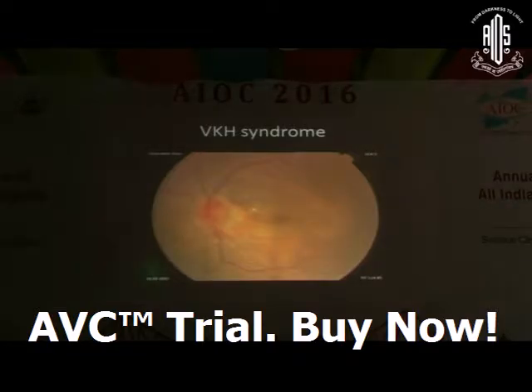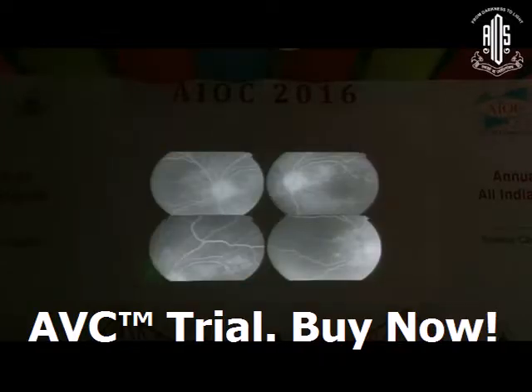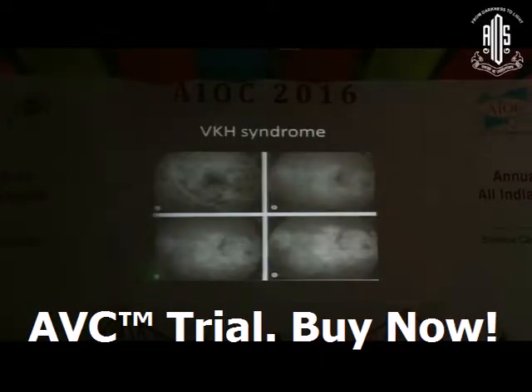It's a bilateral granulomatous uveitis with exudative detachment. There are multi-system involvements also. There's a hyperemic disc and exudative RD in this picture. And on angiogram, and another one here, there are multiple hypofluorescent spots in the early AV phase. As the angiogram progresses, they become hyperfluorescent. Then there are pinpoint leakages at the level of the RPE, and then there's a collection of the dye in the exudative detachment area, pooling of the dye.